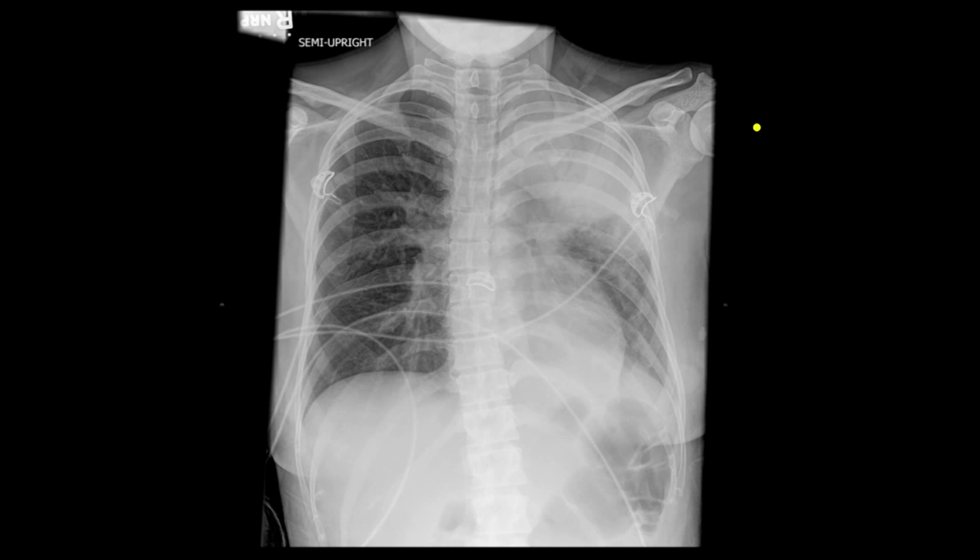In this patient, you can see that the patient has an opacification in the left upper lung. You can also see a suggestion of air-filled bronchi here, so you can see some subtle air bronchograms, which is characteristic of consolidation. And you've also lost visualization of the aortic arch, and so this is characteristic of left upper lobe pneumonia. Also, you can appreciate that the left hemidiaphragm is not clearly seen, and you can see a little bit of increased density, again, perhaps with a few air bronchograms here. So the patient also has a left lower lobe infiltrate as well.